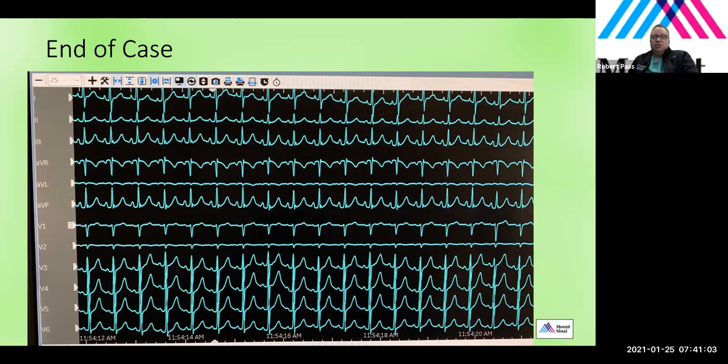So this is an unusual case in that the patient had essentially 2, if not 3 mechanisms of tachycardia. Had a left-sided, you could say, a concealed pathway, with a left-sided antegrade conducting WPW pathway, or you could say that this was just a single slanty pathway on the left side, in addition to having atypical AVNRT.